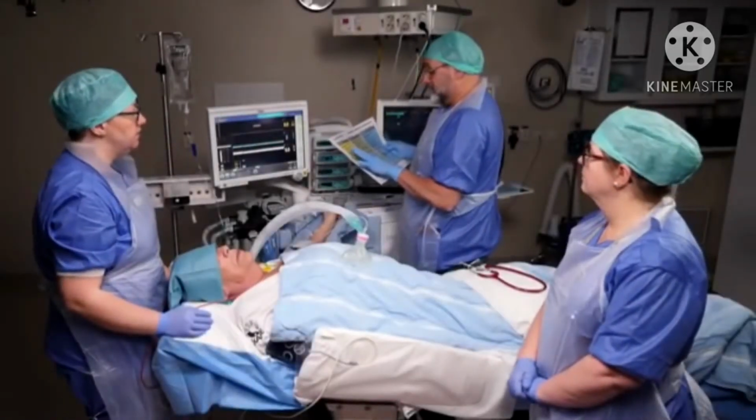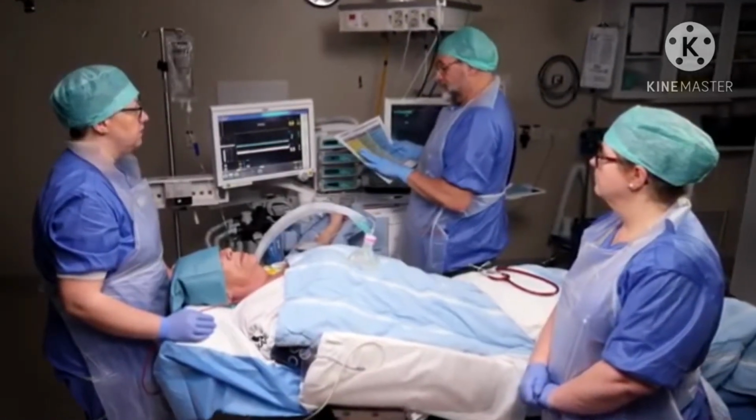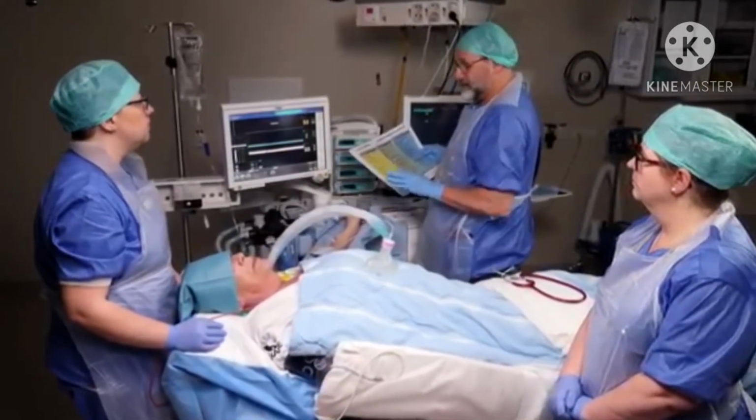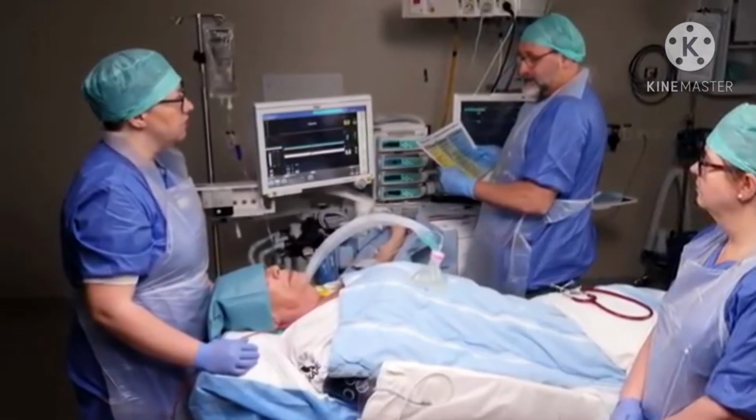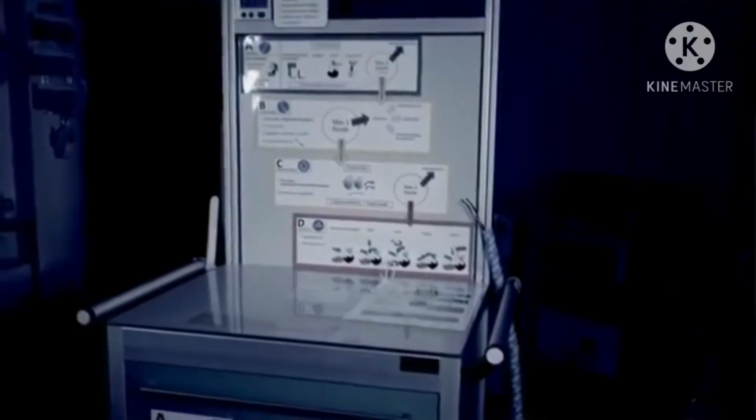Your intubation should always be preceded by an airway assessment. What equipment and personnel does the patient in front of you require? Are there complications you suspect may arise, and is everyone on board with the plan if they do?